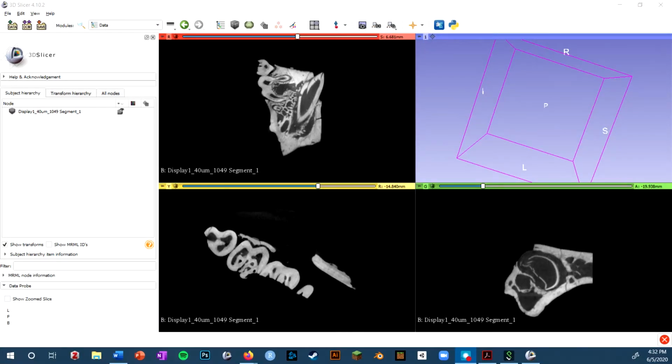Now that you're able to import some data into Slicer, we can go over the basics of navigating Slicer. The window is basically broken up into three components: this top toolbar, the viewport with your data, and the module tab where you will contain the primary tools that we're using. The top toolbar is kind of a mix of miscellaneous things and the most important tools. So there's a couple I'd just like to highlight for you.